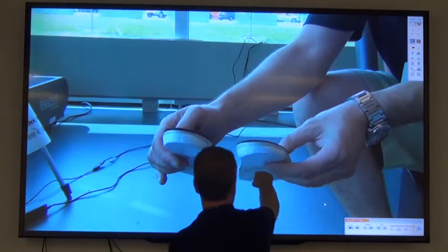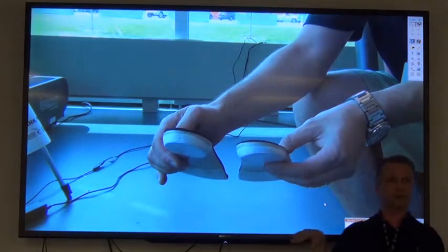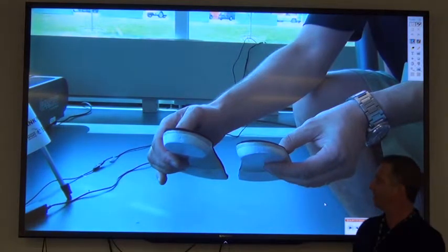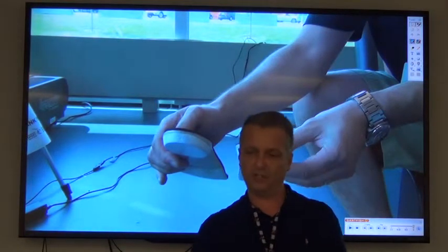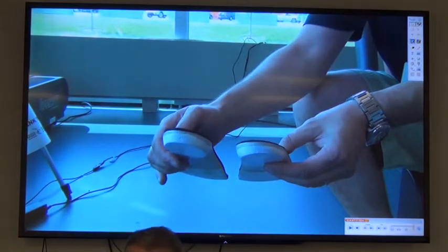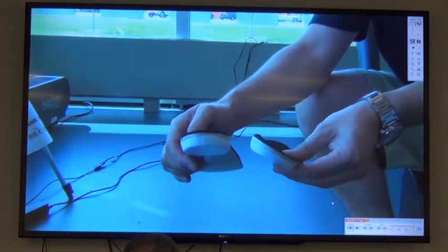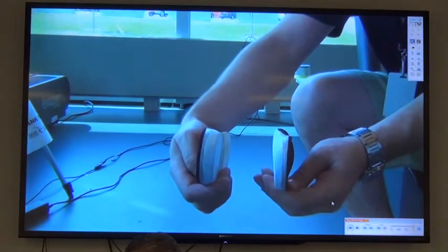So can you see the wedge there? And then you can see the thicker wedge that's sort of straighter across. This one actually is tilted towards the thinner and then the thicker on the inside. Okay. So she's using these orthotics as well in what's called pronation control shoes. So I'll just show you the different, so you can see the differences there.